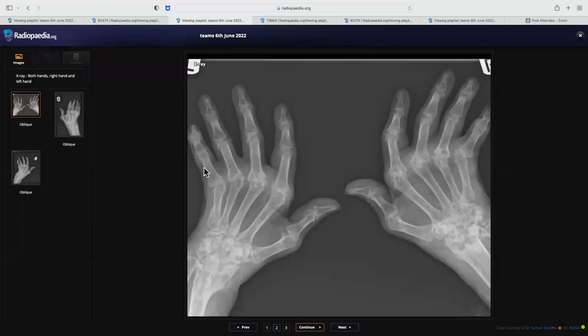Okay. So now what do you think this is? This is now the rheumatoid. I'm thinking about the rheumatoid, if the bone density, especially the symmetrical. And you also mentioned marginal erosions, and you mentioned metacarpophalangeal joints. Yes, the involvement of the joint, the density, the erosions, this pattern can go with the rheumatoid.